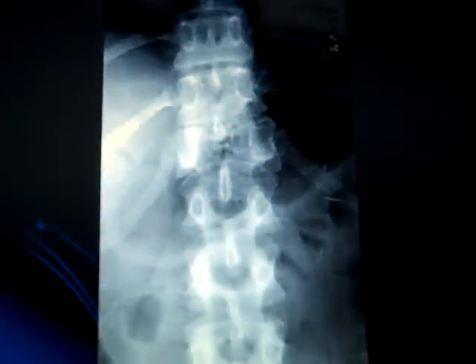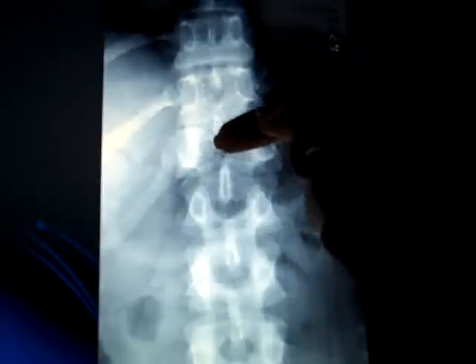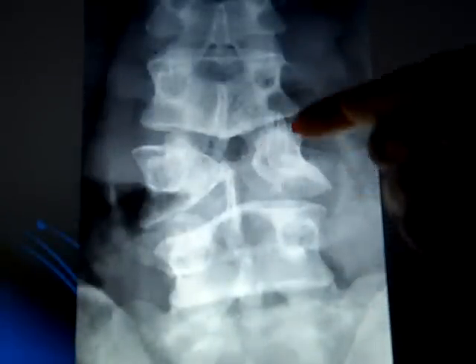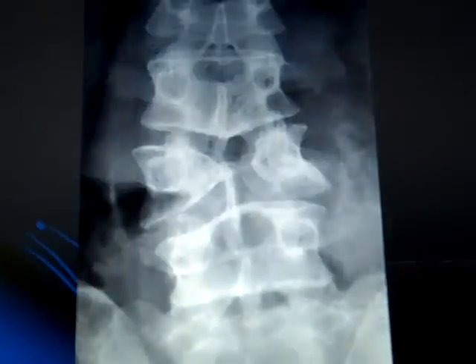Looking at this one, the butterfly vertebra is right here. Here is one side, triangle. Here is the other side, triangle. And so that is a butterfly vertebra. We have on the next film, triangular piece, spinous process, giving you a butterfly vertebra on that film.